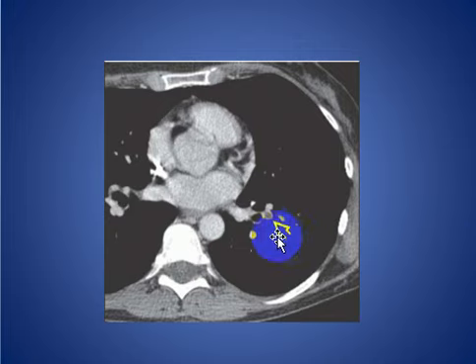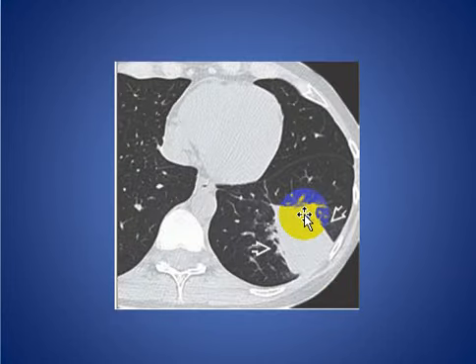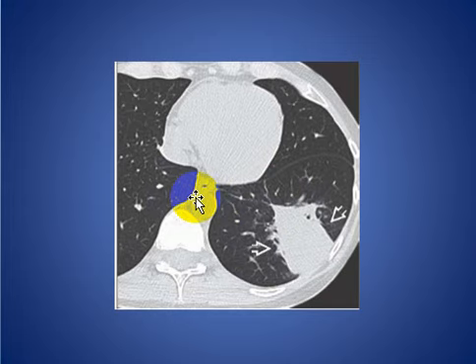Here, patient with axial contrast enhanced CT scan, there is a filling defect in the left lower lobe pulmonary artery consistent with pulmonary embolus. And this is the same patient after 14 days, there is worsening of the chest pain, and we have revealed peripheral wedge-shaped area of consolidation distal to the pulmonary embolus, and this is typical of pulmonary infarction.